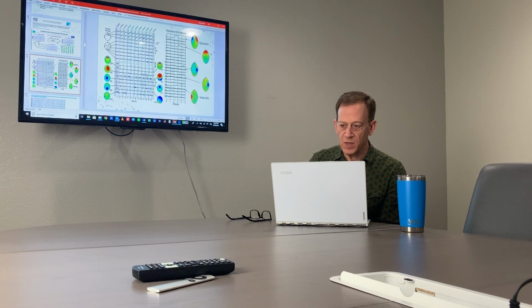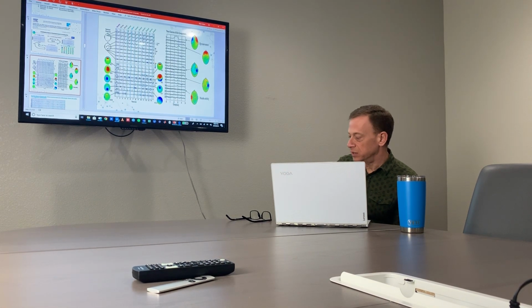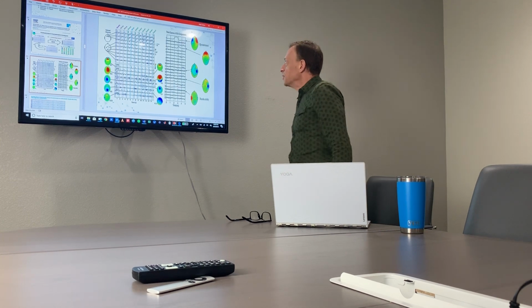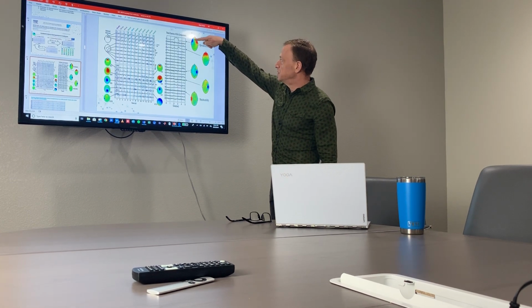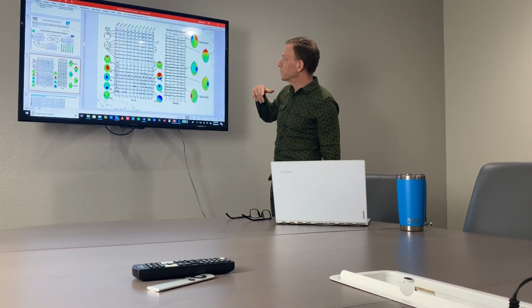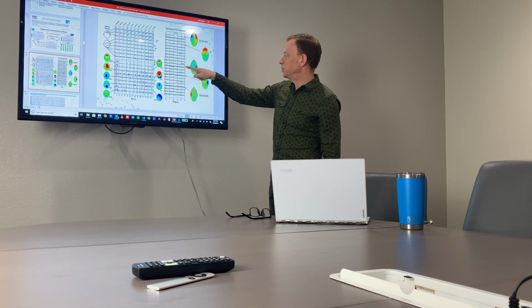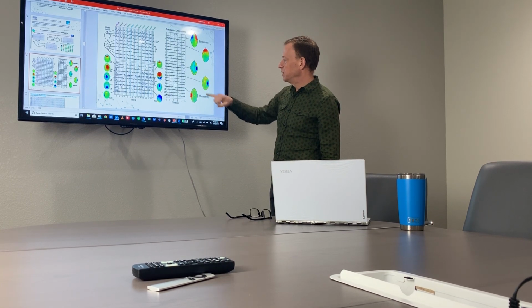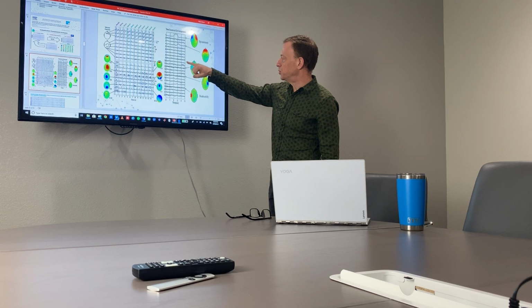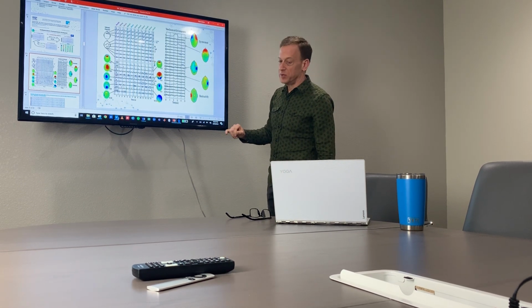I think I have an example down here. So for example, here you can see, sorry, let me get close to the screen here, this top one is an EEG eye movement, a blink essentially. And here's a similar one here. This would be what's called muscle activity. And these in here are different components of real EEG that we want to keep, but they're different from each other.